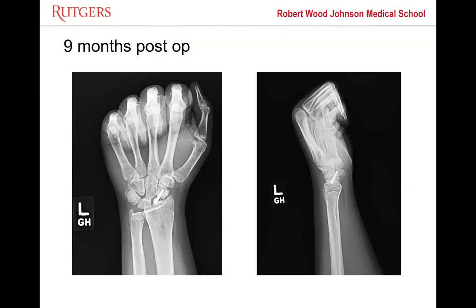And then can you make any comment with the distal fragment? What's starting to happen there where it articulates with the radial styloid? Yeah, you're starting to get a bone spur there. So this is like a stage 1 arthritis. Okay, so what do we do now? Jamie, is this when we bring out the vascularized graft?